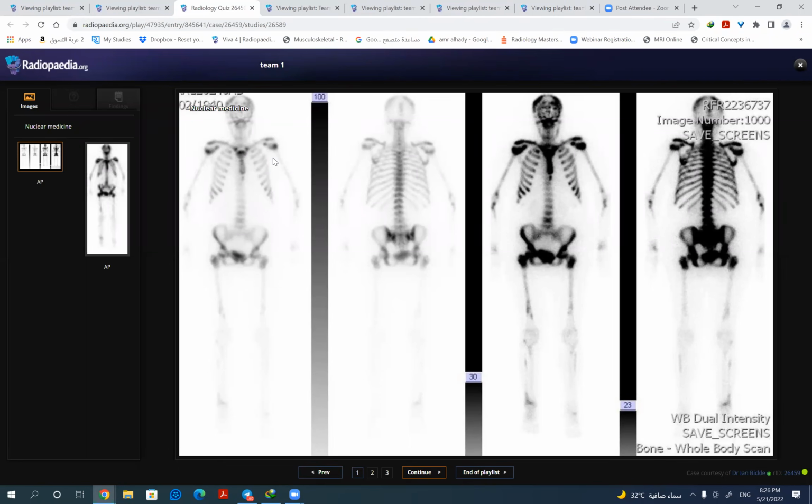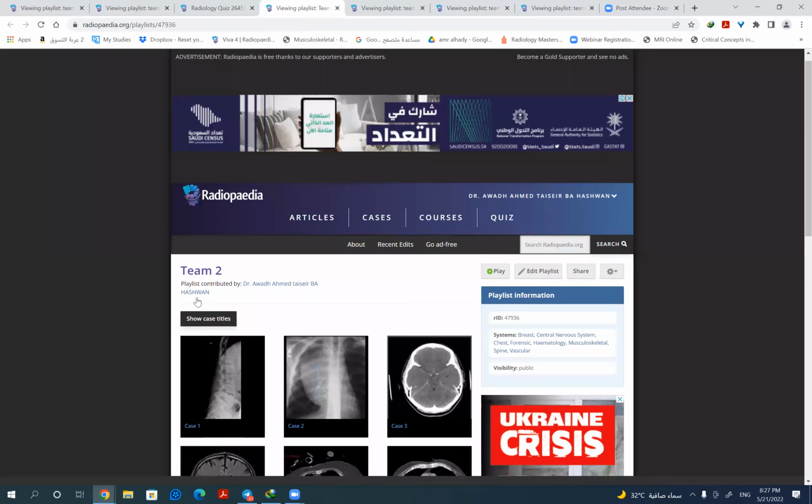What other causes of super scan? The other causes of super scan are metabolic, which include hyperparathyroidism, renal failure, hyperthyroidism, and sarcoidosis. So yeah. Sarcoidosis? What do you mean, sarcoidosis as a cause of super scan? As part of hyperparathyroidism or hypercalcemia, metabolic. Okay. Okay, next.